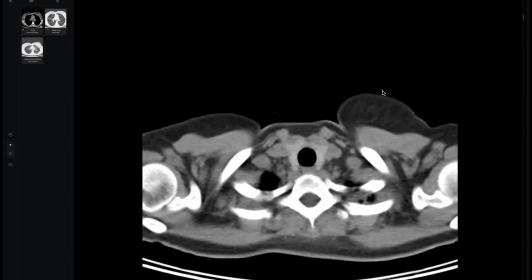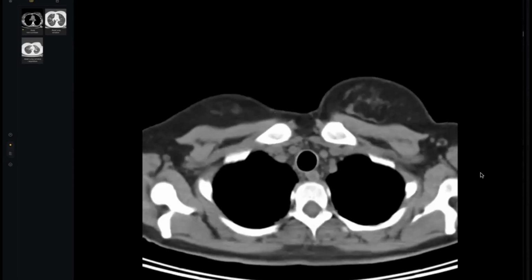Don't worry. My colleague requests the control. Assalamu alaikum, sir. Request control. Yes, sir. So this is CT chest. Sir, I'm trying to scroll. One second. Use the arrow. Yeah, sir, it's not moving.